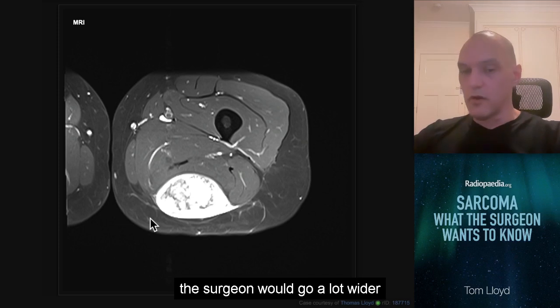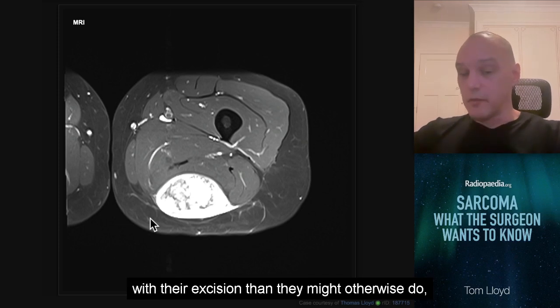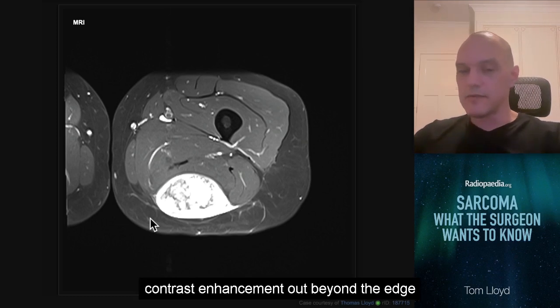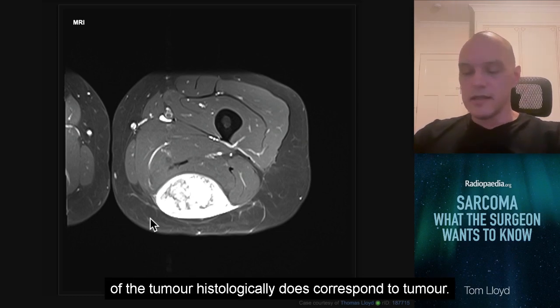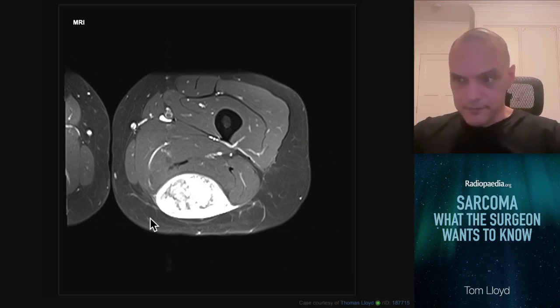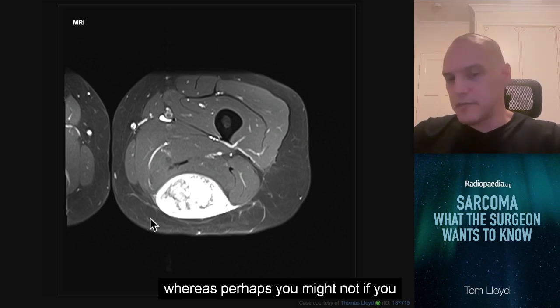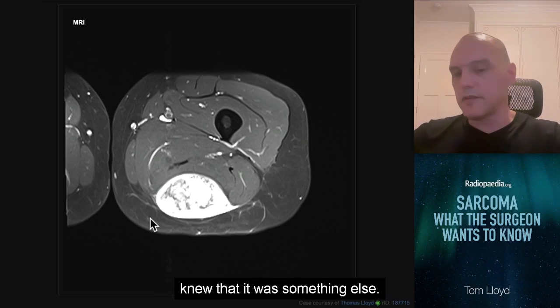The surgeon would go a lot wider with their excision than they might otherwise do, because that edema and contrast enhancement out beyond the edge of the tumour histologically does correspond to tumour. So if you know that particular subtype, you make an emphasis on this, whereas perhaps you might not if you knew that it was something else.